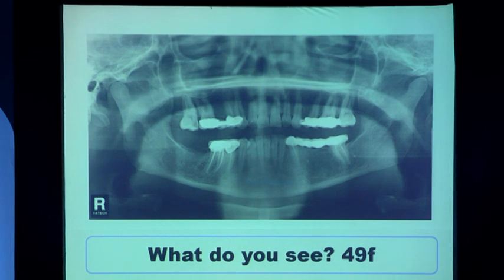What do you see? What do you see? There's a pattern to it. I'm going systematically. I started with the anterior nasal spine. I went to the posterior nasal spine. Then I came down. Then this again. Follow a pattern. There's a pattern. Like the interpretation of radiographs follows an organized pattern. It's a systematic process, right?